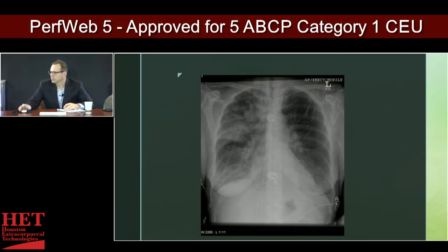Oh, okay. There's just no wire. So on the balloon pump leads, et cetera. Okay. Yeah, that's it. And you can see the wire. The wire is running straight here. Okay, now I see it. Yep. Here's one over here.